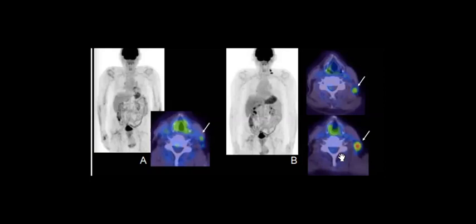Metabolic regression, or metabolic progression, or metabolic stability. What will you choose? So it will be metabolic progression, yes.